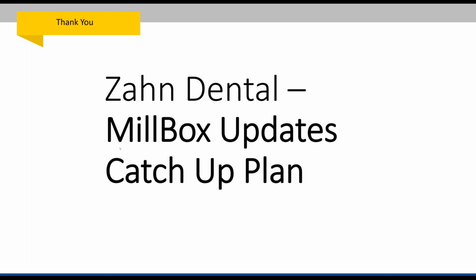They're going to bring you to Millbox, which is an improvement. If you're on older versions, they're going to bring you current, and they're going to make sure you have the comfort features. Comfort features have things like we talked about today: the multiple import of restoration files, the smart automatic support pins, a lot of artificial intelligence that's just doing things automatically for you in the software. The mobile notification feature, stock selection, all those are comfort features, and many more actually that we didn't have time to get to today.